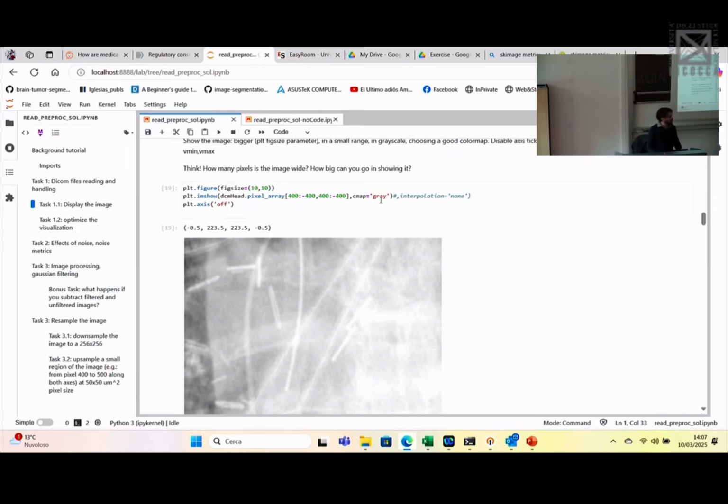But just to see the effect of doing that, you can play around with all the color scales that are available in pyplot, which, if you go to the documentation page, you can see that it's like 100, if I remember correctly, or so.